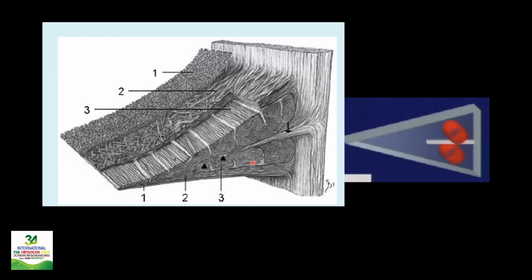Now coming back to the structure which we have discussed, you can again appreciate that these are the longitudinal bundles, which are tough bundles and hard to break.